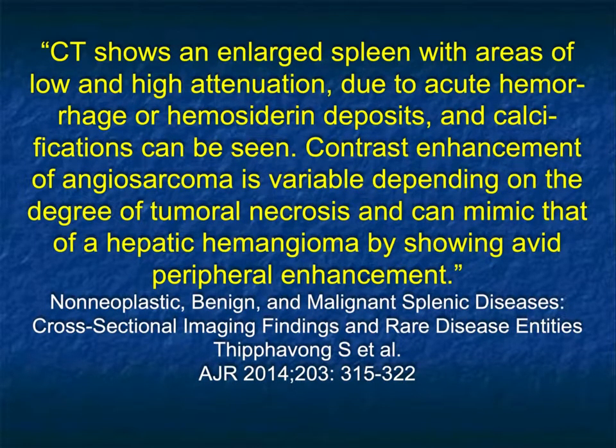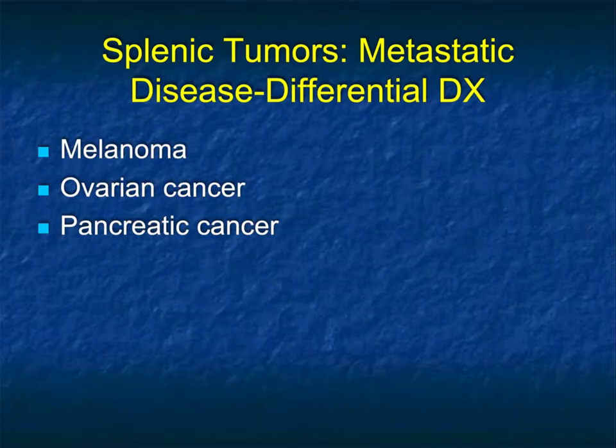Contrast enhancement of angiosarcoma is variable depending on the degree of tumor necrosis and can mimic that of hepatic hemangioma by showing avid peripheral enhancement. Now, I have to admit, I've not had the problem of being confused between an angiosarcoma and a splenic hemangioma.